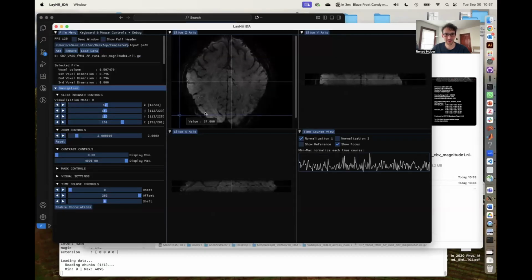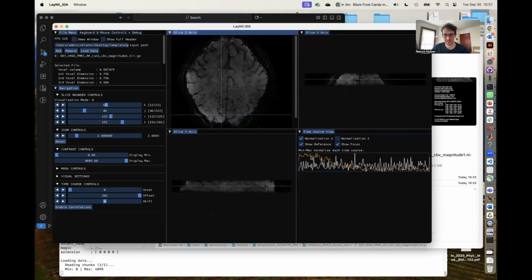For example, when I look at any time point here, you might actually already see the on and off structure of the task, slightly block design. And then the last time points are kind of jumping down, right? There's no signal over there.